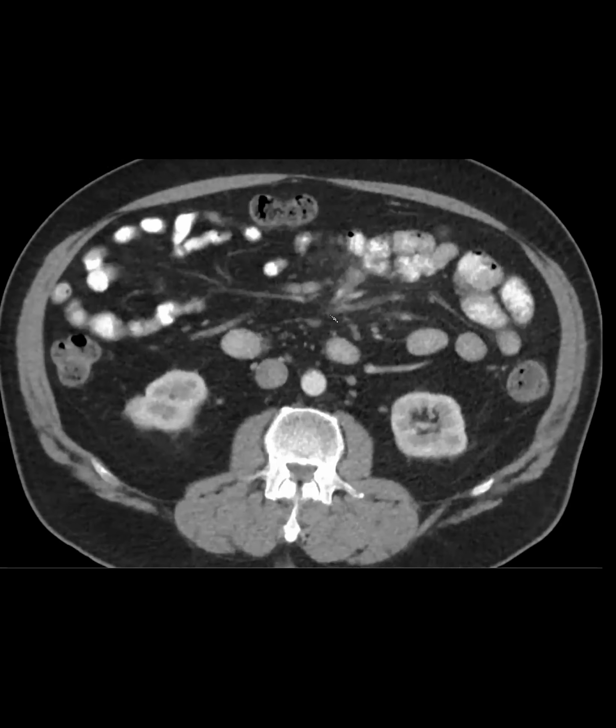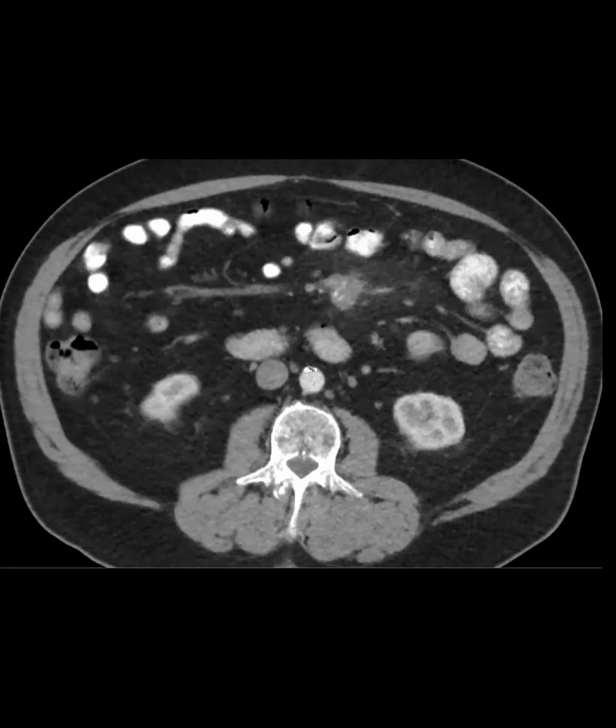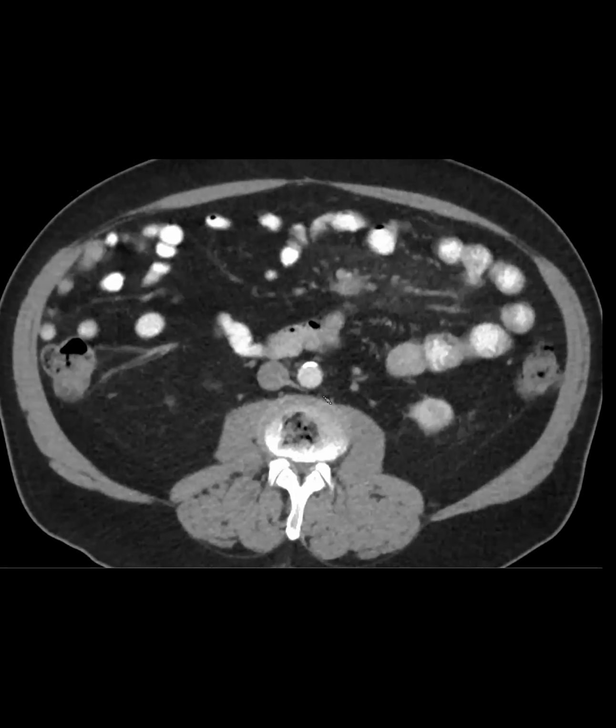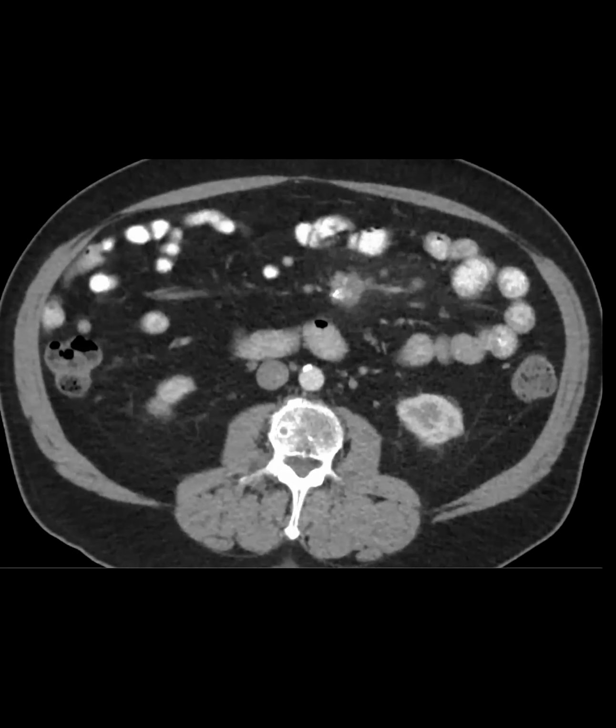When I see more extensive calcification, I think about sclerosing mesenteritis. There is a little bit of stranding and maybe a pseudocapsule here, but basically we said neuroendocrine lymph node met versus less likely sclerosing mesenteritis. This was biopsied. It came back all inflammatory and fibrosis. And so they said it could be sclerosing mesenteritis, but we cannot exclude fibrosis related to neuroendocrine tumor.